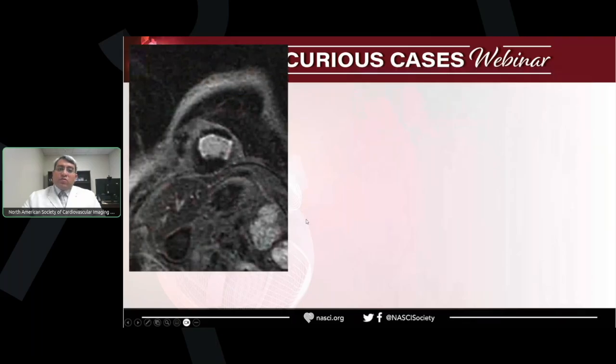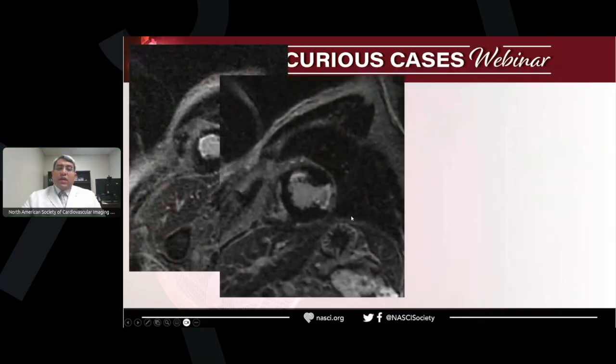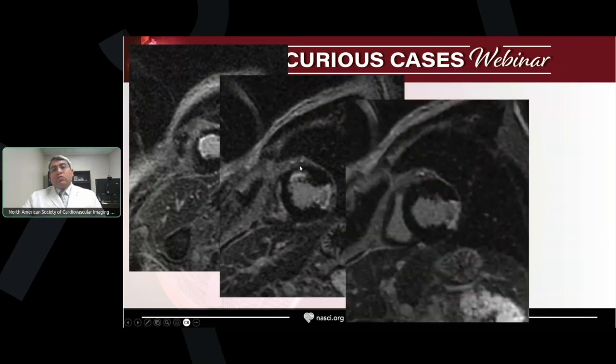So the patient proceeded in the exam and they did contrast imaging, and we found that along the lateral wall there is transmural enhancement, and this means it is non-viable. But there is something here, in the subendocardial area, with normal wall thickening along the anterior wall. So this patient, in addition to the old or chronic myocardial infarction laterally along the LCX, has a new anterior wall subendocardial infarction along the LAD, which has about 50% myocardial wall thickness. And this could be viable if they would like to do revascularization for this patient.